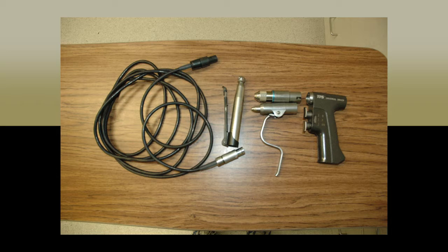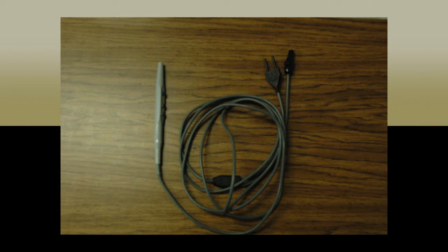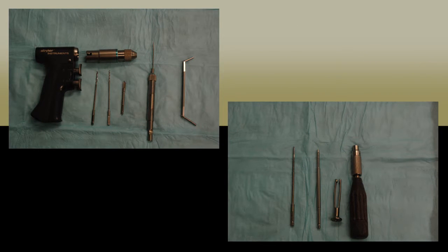Many of the instruments used in surgery require assembly throughout the procedure, especially anything requiring the insertion of a bone screw or cut. Within the instrument pack are saw and drill kits along with their power cord, as well as the electric cautery Bovie system. When the physician is going to place a piece of hardware, he will utilize the drill set as well as the screwdriver set. The drill set must be put together in order to be operational.